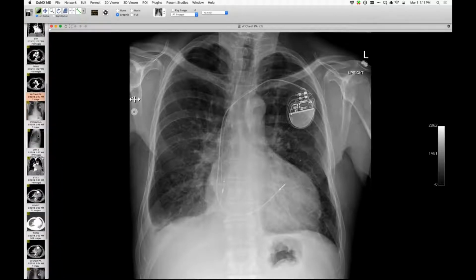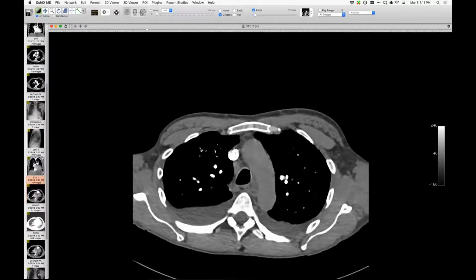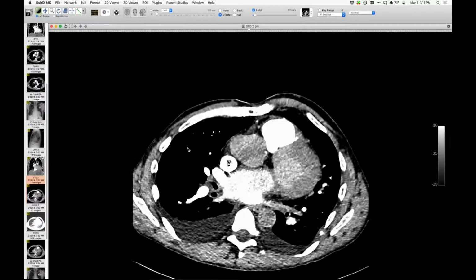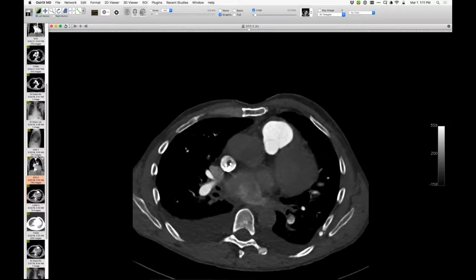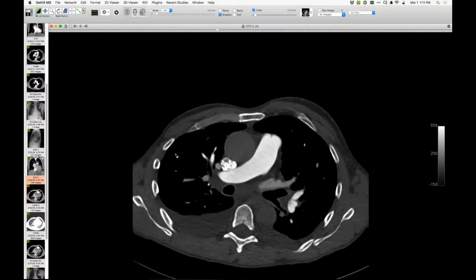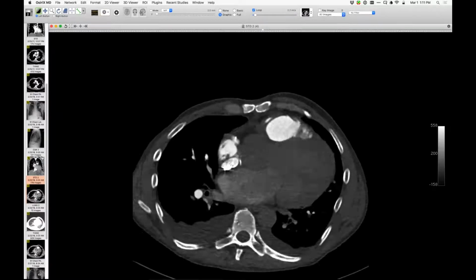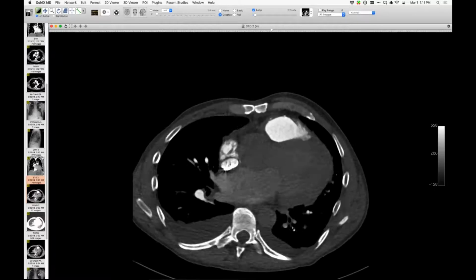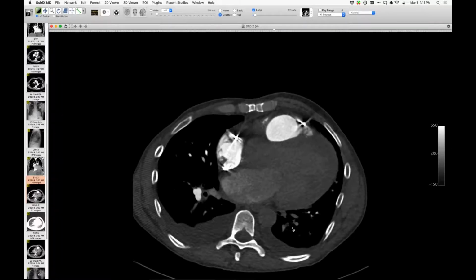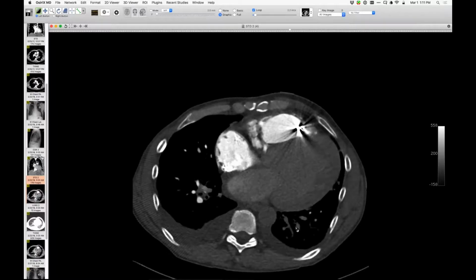That is on the 22nd, and here let me show you a CT done on the same day. You can see here, using the same protocol, that we didn't even have enough time to really get through the pulmonary arteries completely, even in the lower lung zones. The contrast medium going through the heart has excellent opacification so far, but not so good when you get down here, particularly on the left side, where the scan is over before the contrast medium has even passed through these pulmonary arteries to get back to the left atrium.